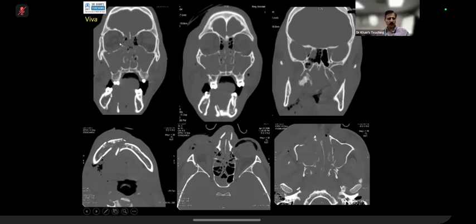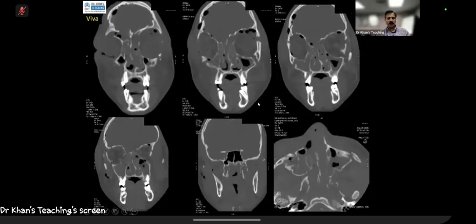And considering if this is present, then it will become a 3 on the right. Yeah. Left. Yeah. This, on the other hand, is bilateral 3. If you can see here, the pterygoids, the medial wall is gone, and the lateral wall is gone, pneumocranium, etc.